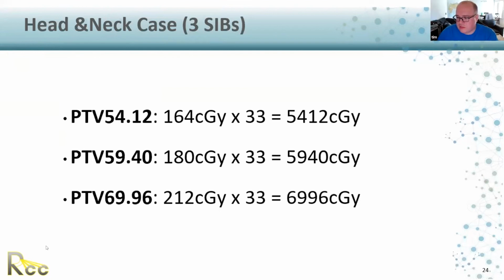And do you have a suggestion for what your IMRT factor would be? And that's the MU divided by the dose per fraction for head and neck. For head and neck, usually it's 3.5 something. It reaches up to 5. So from 3.5 up to 5. So more or less, this is your factor, what you are talking about.